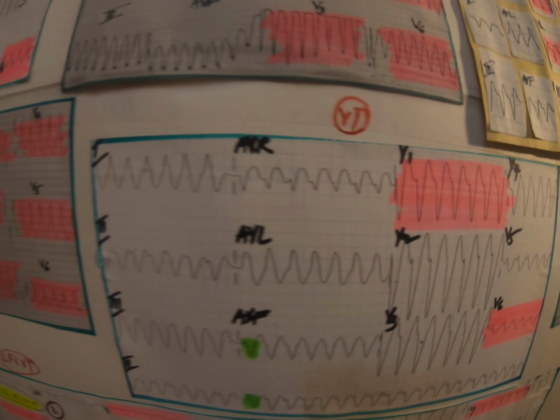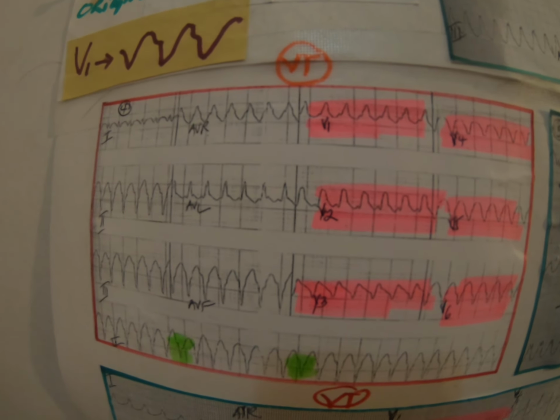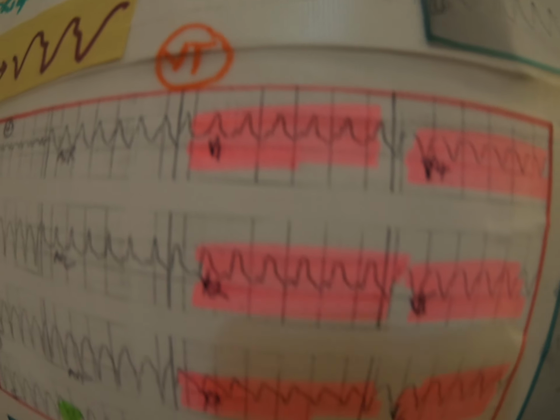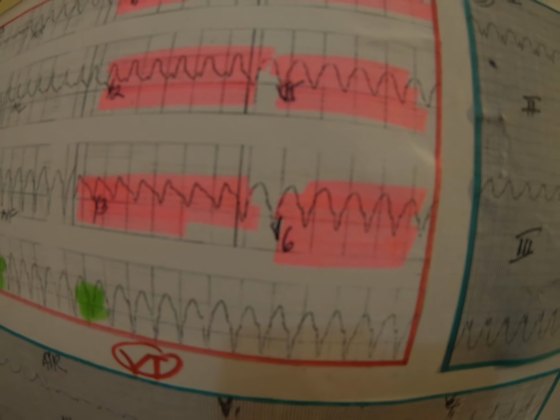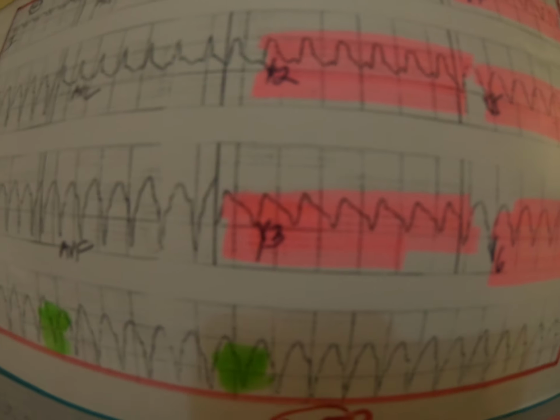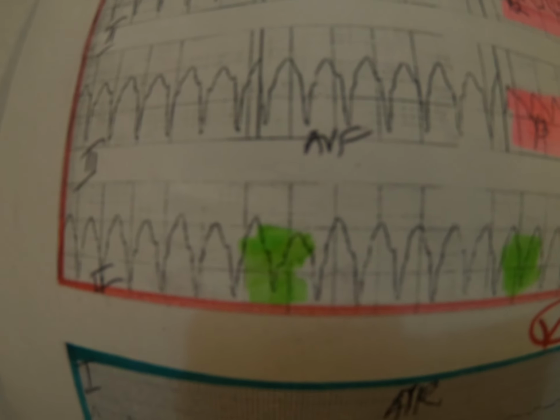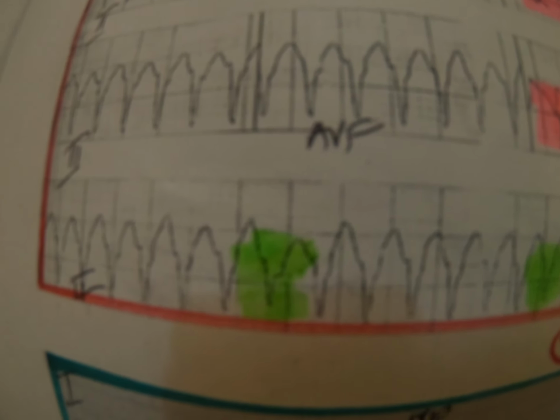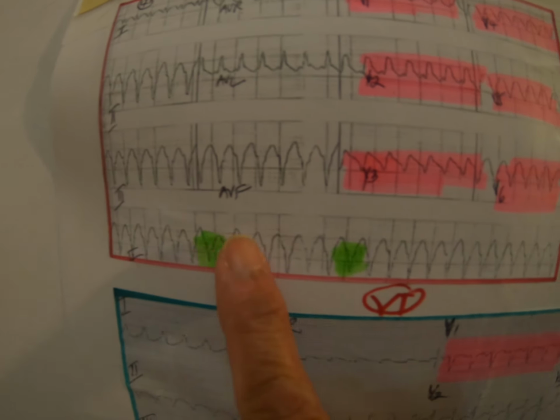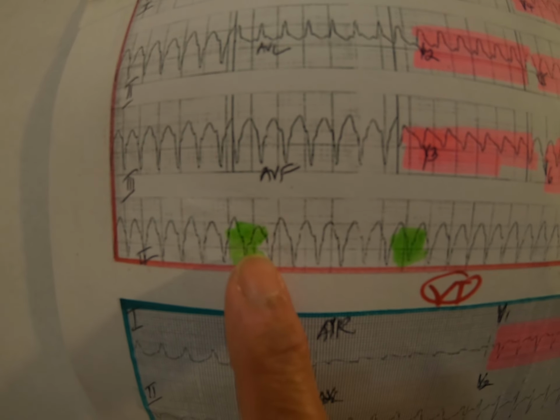Okay, I skipped the other one, the 12-lead ECG here. It's VTAC. This one I showed you earlier. So we have an upright V1, and then here downward deflection, positive for VTAC, but I will not say that yet until maybe I see this one. So this one concludes it. So we have here probably a fusion or capture beat. This is a rhythm strip here, but something is inserted here.